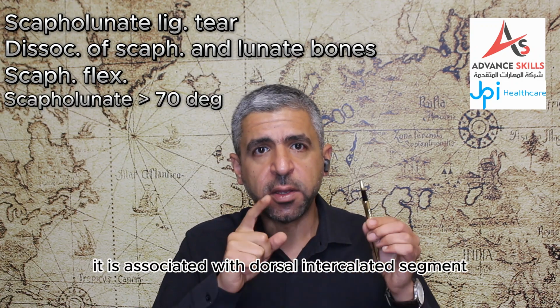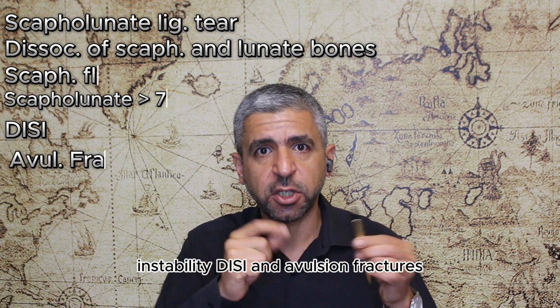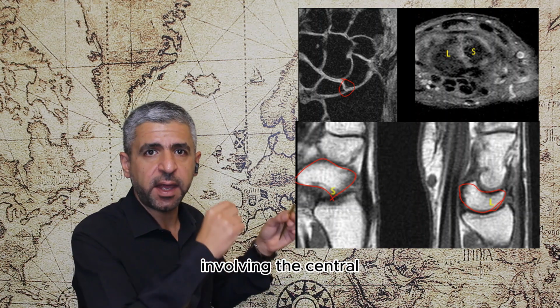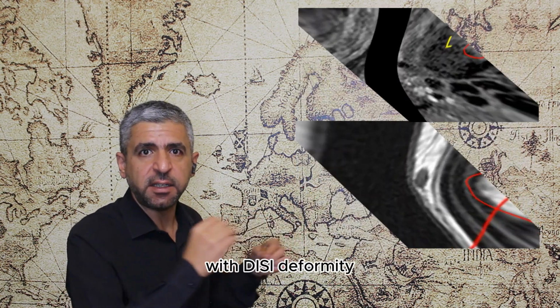It is associated with dorsal intercalated segment instability, DISI, and avulsion fractures. Like we see in this case, we can see a tear of the scapholunate ligament involving the central and dorsal components of the ligament with DISI deformity.